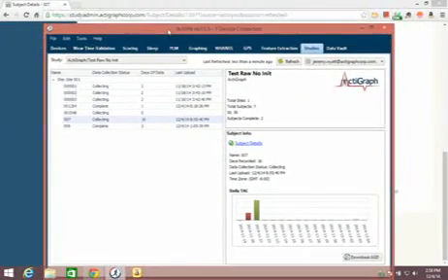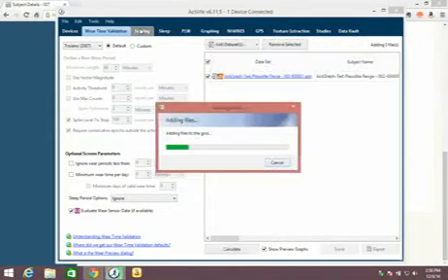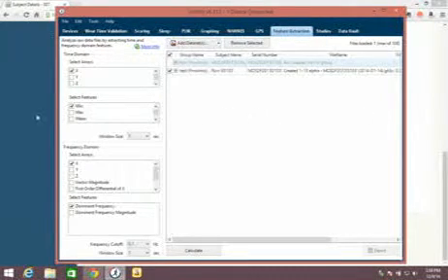If I want to download this data directly into ActiLife, I can do that by clicking Download AGD, and it will immediately be available for consumption. I can use my own wear time validation algorithm, my own scoring algorithms, and I have access to that data. Up until today, that is possible with 60-second epoch data. That's what I wanted to show with how that particular feature is used.